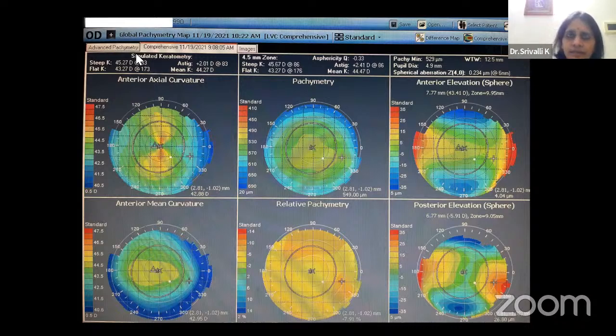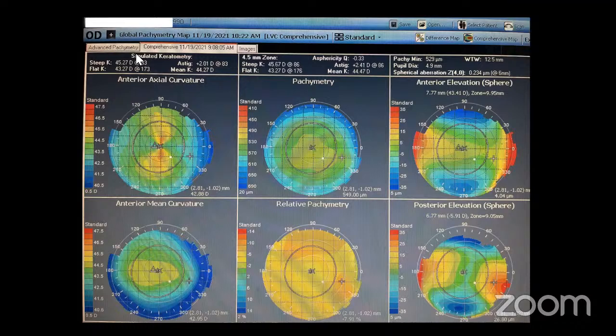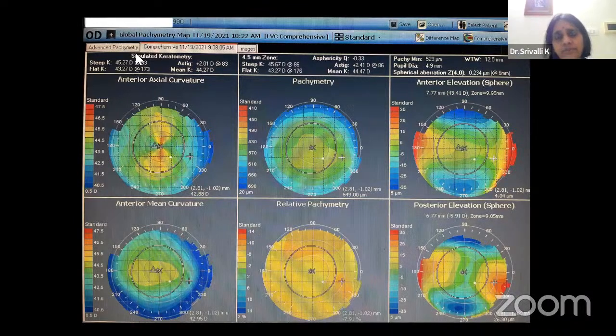It's not just that only those which are less than 500 will be keratoconus. You can have keratoconus which is still as of now more than 500, but it may progress in future, right? Yes, ma'am. And sometimes you can have a 460 kind of cornea which is normal. There's no steepening, there's no ectasia. It could be a normal thin cornea. But the idea is you have to identify these, and with a very thin cornea, you should not be doing any refractive procedures which may cause further problems. Okay.